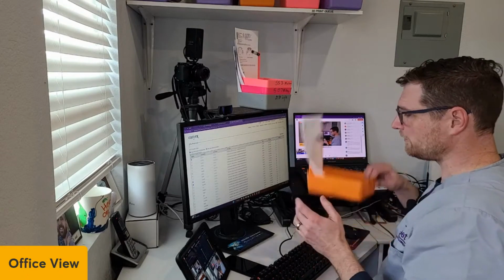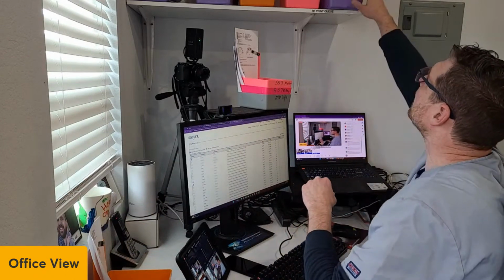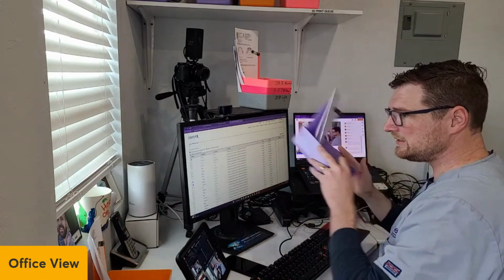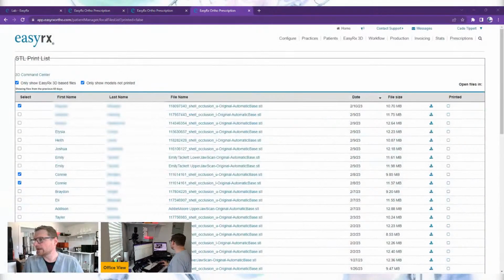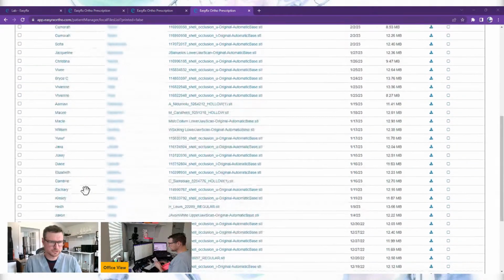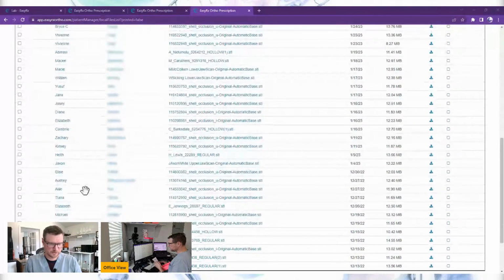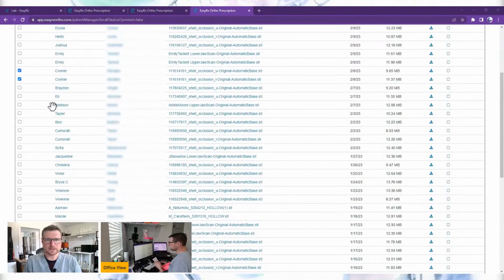I'm going to set that over here. I got those 2 selected. I have this one we just did select it, and that is that left-hand side over here. So that's that left-hand side. I'm selecting the ones I want to print. So we have one here. I don't know if I'm going to have both of them or not. Sometimes, like I said, it rejects the lower, and we'll have to go in here and do those by hand, and that's fine. Oh, I got it. This is the upper jaw scan.